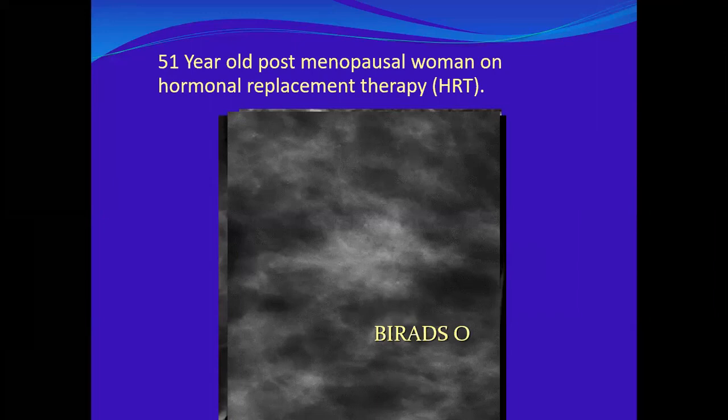So, what is your differential diagnosis? What could it be? If it is malignant, it could be DCIS.